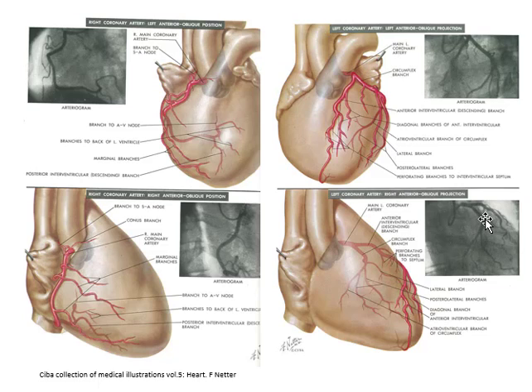The pictures are a little small to be of much use, but if you look at the top left, you can see this is the LAO view for the right coronary artery, and this is what is referred to as the C shape. Again, I'm a little bit skeptical, but it's a guide. LAO gives you that C shape. And the other view is the right coronary artery in the RAO position, the profile of the heart.